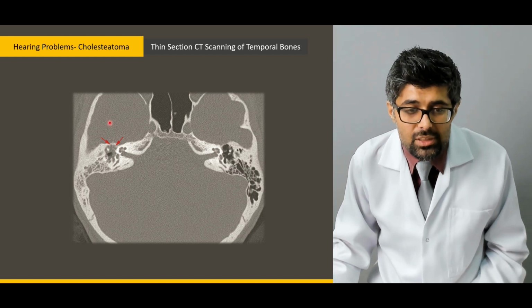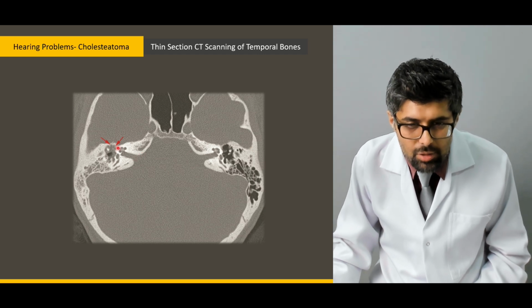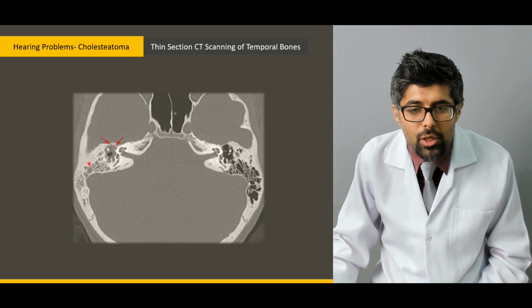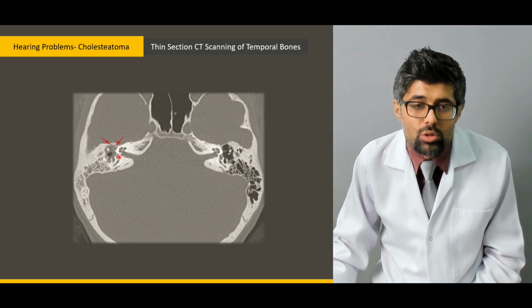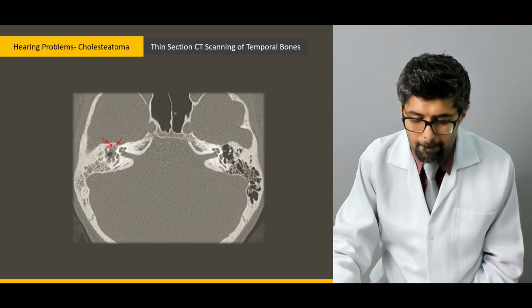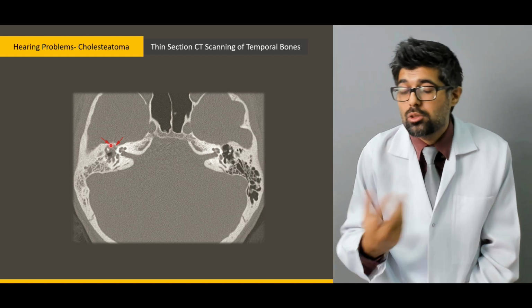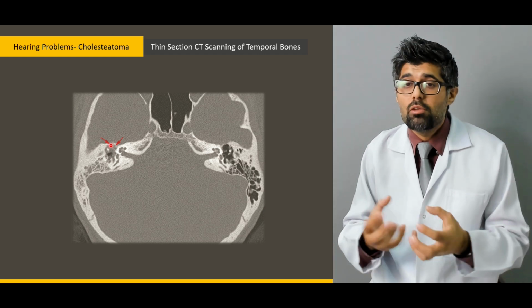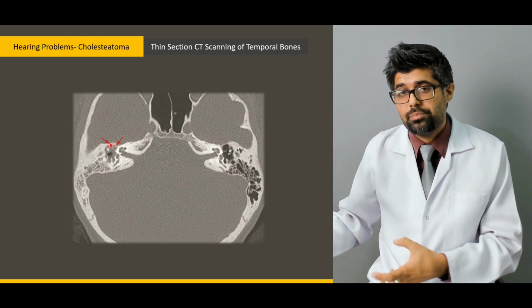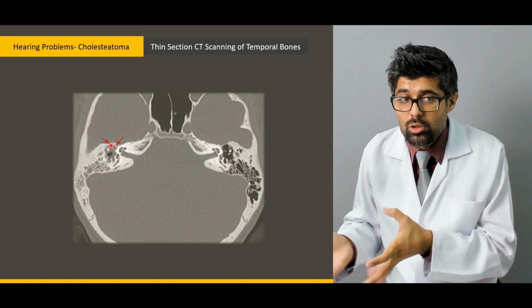Because of this, we can see it here. If you just compare both sides, this side is totally eroded, and this is because of a cholesteatoma. Because of this, the patient is having a hearing problem, because like I said, it starts from the middle ear. So the patient suffers from hearing loss.